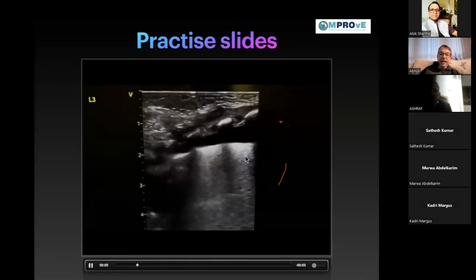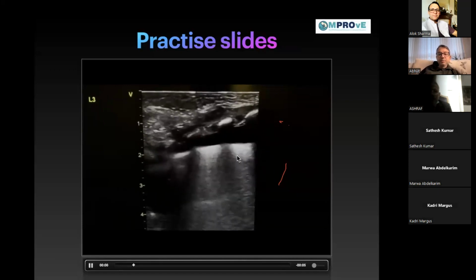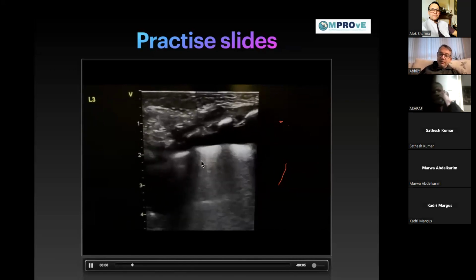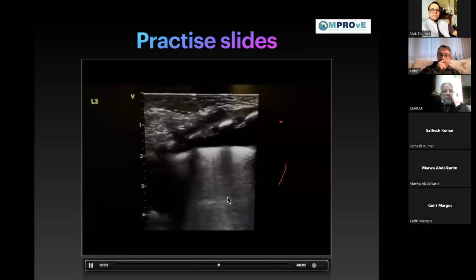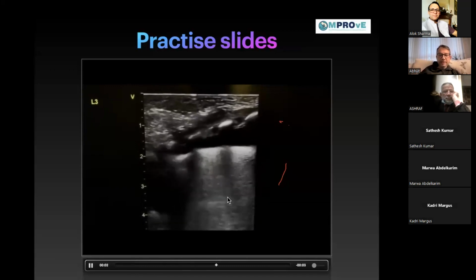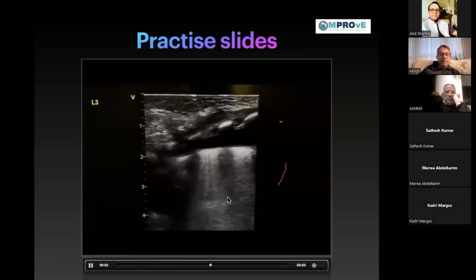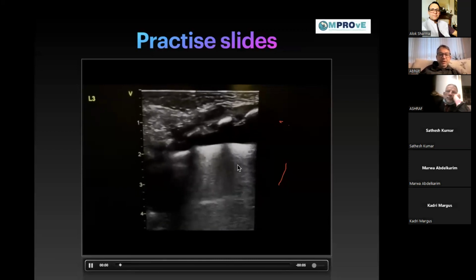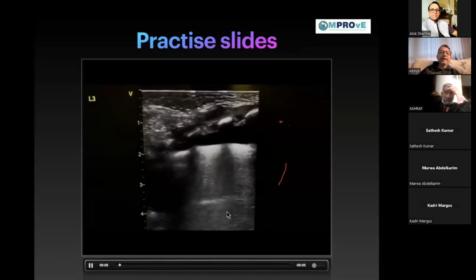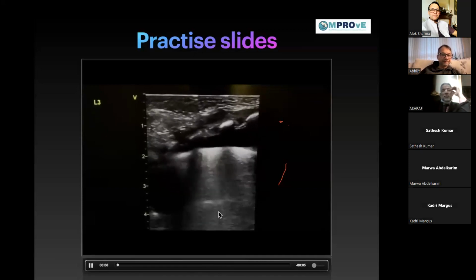So when you do that, your pleural line, if it is a normal lung, will become a very discrete, smooth, sharp, white echogenic line. And if you're dealing with some kind of pathology here, collapse or consolidation, that's what you're going to see: a broken pleura, a fractal sign or a shred sign, and the bronchograms, the signs of collapse or consolidation. So you have to see all the zones and interrogate the area more in depth, rather than just being happy about seeing the pleural effusion and ignoring the rest of the lung.